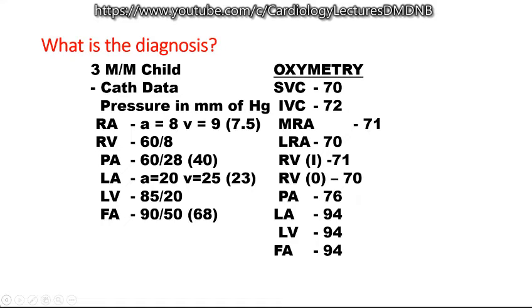No, the LA musculature is slightly thicker than the right atrial musculature. It is less compliant, and when the volume of blood comes into the left atrium, the pressure in the left atrium rises faster than in the right atrium. So in a normal person, when you look at the A wave as well as the V wave, usually the left atrial V wave is slightly taller than the left atrial A wave. It's only marginal. Very often it is equal. Here the difference is 5 millimeters, indicating that something more is happening.